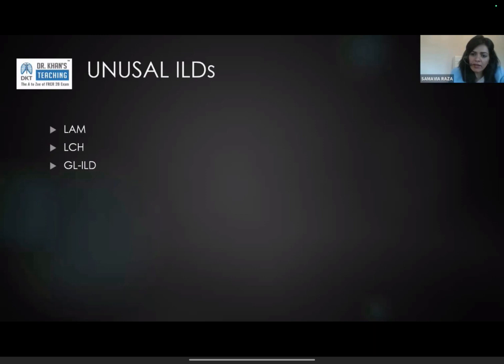If there is mosaic perfusion, where the expiratory scan shows air trapping, can we give a differential of pulmonary vascular versus small airways disease? If you have an expiratory scan that shows you air trapping, that gives you a definitive diagnosis of air trapping and airways disease. You can then kick pulmonary vascular abnormalities out of the window and give only airways disease, because vascular abnormality will not give you air trapping, whereas airway abnormality will.